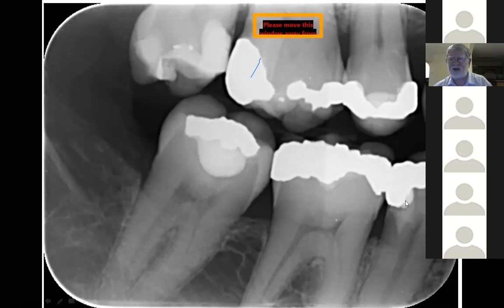If nothing's happening, this is the body's own way of trying to protect itself. It's just like when there may be a large periapical lesion and nothing's happening, and there's all the gunk building up, the body wants to get rid of it by tracking through the bone and discharging into the mouth through a sinus. The body releases itself that way. So yes, secondary dentine.